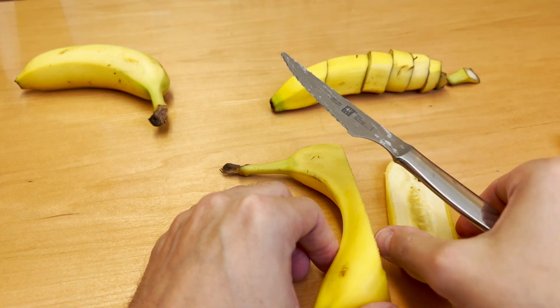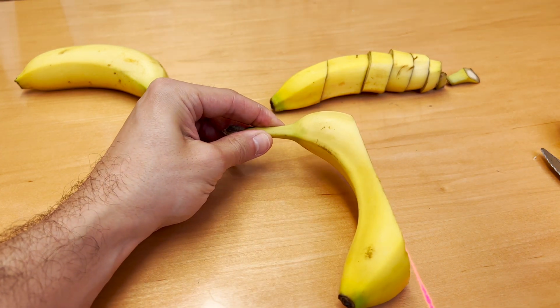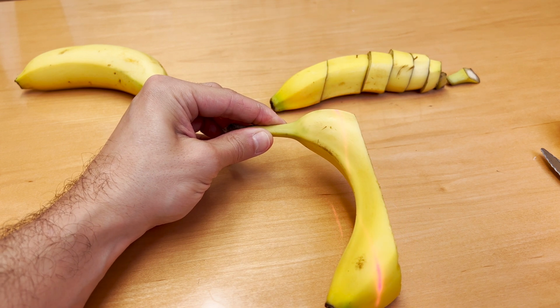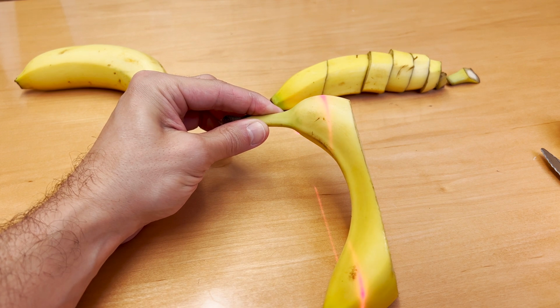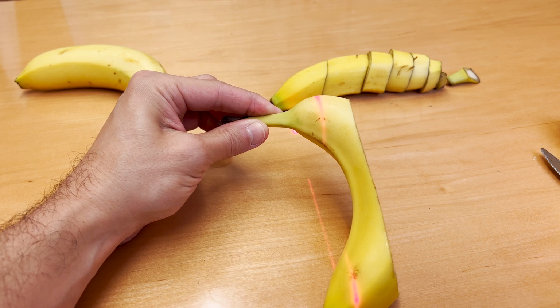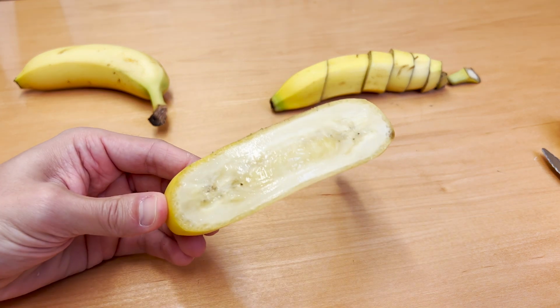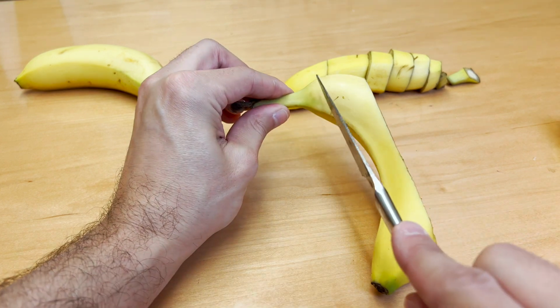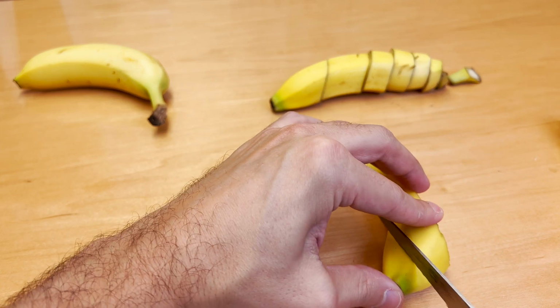Okay. And then we'll do one more cut like this. So this is gonna help us understand the meniscus. If you follow my red line, you can see when we move from here to about there, the banana is actually cut in two separate areas. So instead of it looking like one solid object on this cross section, if our cut goes straight across from here to here, what we'll end up looking at is almost like two separate objects.